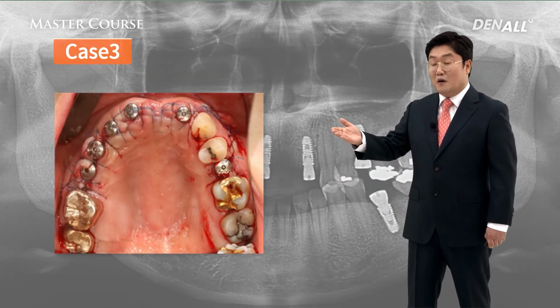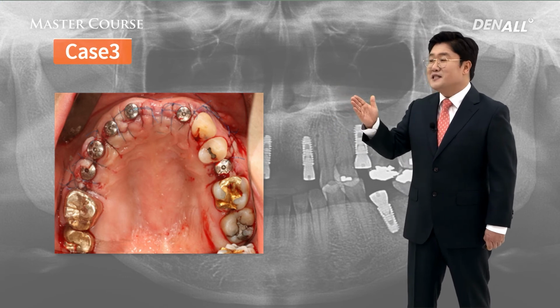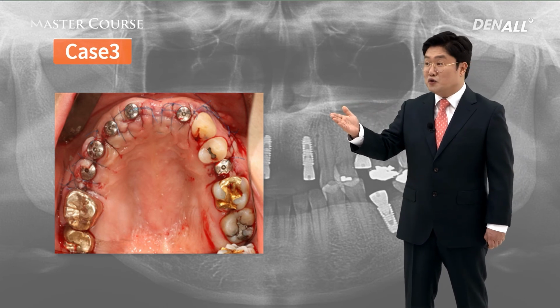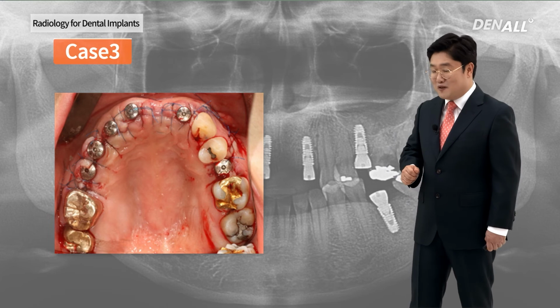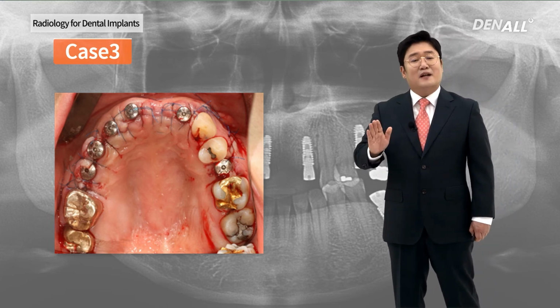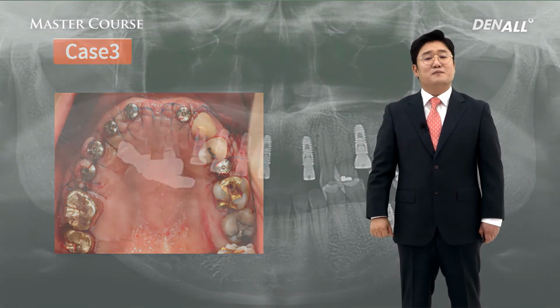Immediate post-op. The positions are good, and the relation with the teeth were quite accurate, generating a good initial stability. So healing abutments were connected and sutured. Panorama can still be used quite actively, and I want to emphasize this.